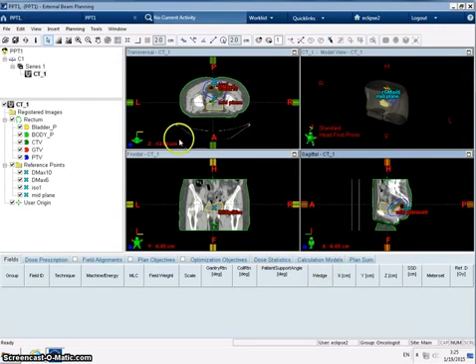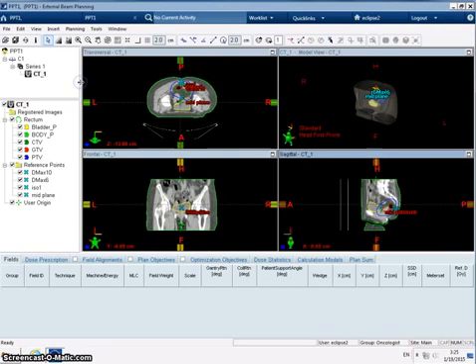And we can see that this is now our patient open. So I'm just going to move that across slightly so that we can make this screen a little bit bigger. So as I said before, a number of tools across here. Down the left hand side is everything to do with this patient, and again we can maximise and minimise those. We can see here CT1 is the image set that we're on. We can see that we've got this structure set called rectum, and within the structure set we've got some structures, and then I've also placed some reference marks in the patient as well.